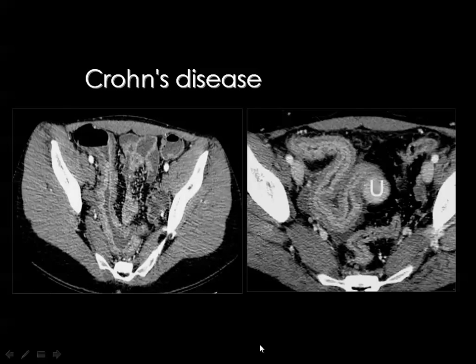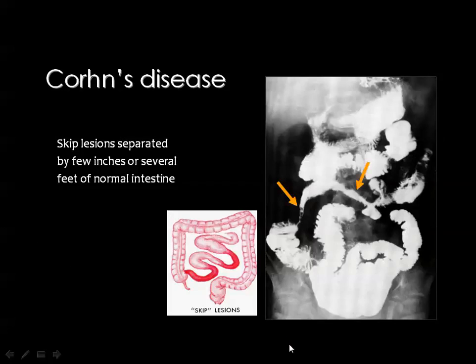And this appearance can also be identified on CT scans. You see, this is one of the terminal ileal loops, and you can see the hypertrophy of the mucosa encroaching markedly on the lumen of the small bowel, as you can see here.